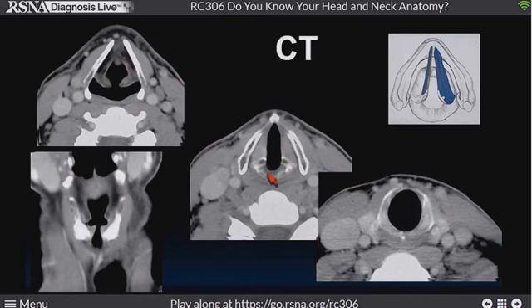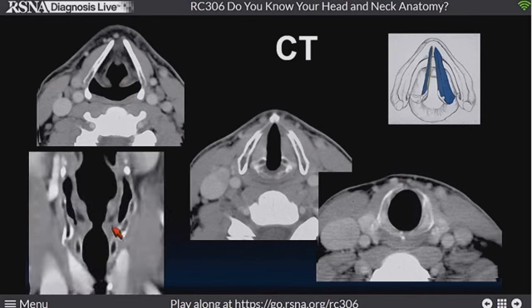Here is our marker slice, so this is right at the cricoarytenoid joint, thyroarytenoid muscle, so you know you've made the transition here, and then the subglottis, so it's fat to muscle to nothing, supraglottic, glottic, and subglottic, and remember the transition of fat to muscle. Here we can see the ventricle, but you can see above it's fat and below it's muscle. And here, even a little bit further back, you don't see the ventricle here, but you do know exactly where it is, and so that's how we are going to describe various lesions that are occurring in this space. So navigating paraglottic space, incredibly important.